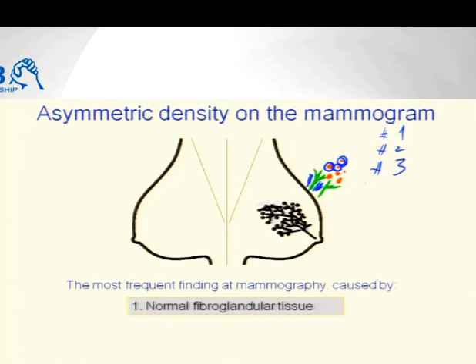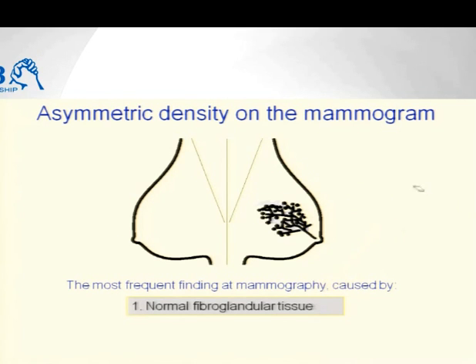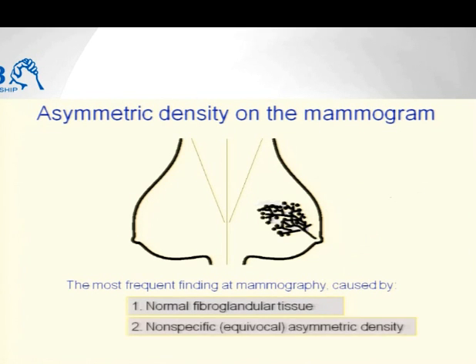Now, if I see 3 out of 4 basic building blocks, and of course the 4th one is what we all dislike, the homogeneous ground glass-like concave contoured fibrosis, then you are looking at normal fibroglandular tissue. If you have a 15% callback rate, then you don't know what the normal looks like. Problem starts here.